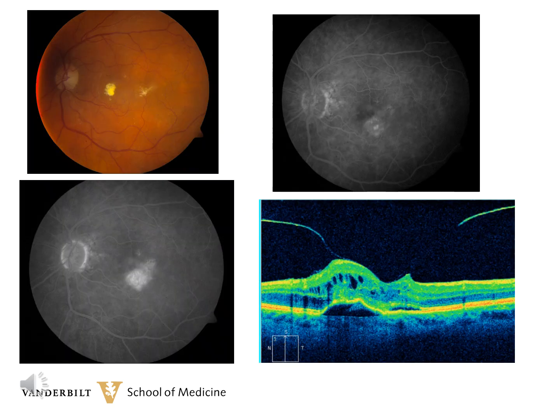This is a patient with type 3 neovascularization, also known as retinal angiomatous proliferans. This is a special type of macular degeneration where the abnormal blood vessels are actually intraretinal, and there's a connection between them and the choroidal circulation. This was first described in Retina by Yannuzzi et al.